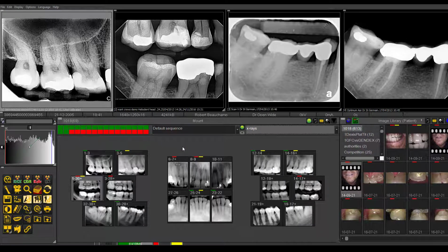Today we're going to be going over how to create a macro within the software. A macro in layman's terms is just being able to program a sequence of steps in a one-click fashion. What we've done here is create these customized buttons for different imaging technologies that we plug into the software. This is an example of a macro that we've created to launch a specific hardware that we have integrated. So how do we do a macro?